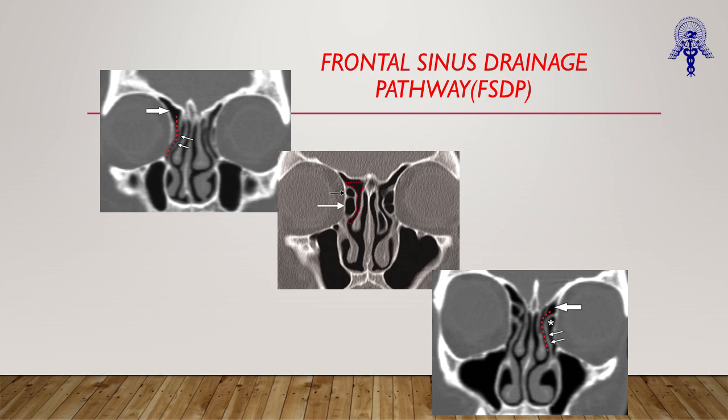It is a recess where the frontal sinus collection comes and drains into the infundibulum, and that recess architecture and the wideness or narrowness is decided by multiple factors. Who can tell? What decides the architecture of frontal sinus, whether narrow or wide? So it depends on the thickness of the frontal beak. Yes, upon the pneumatization of the Agger nasi cell, the thickness of the frontal beak, and the type of Kuhn classification of frontal cells that we have.